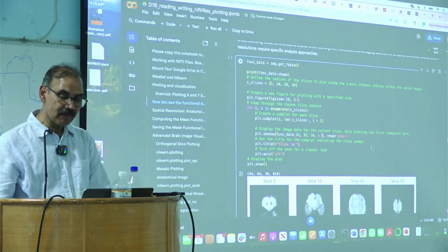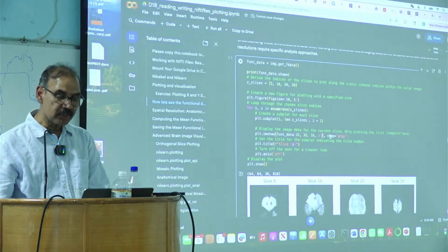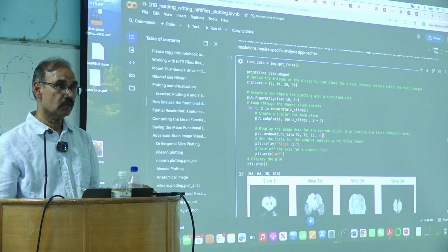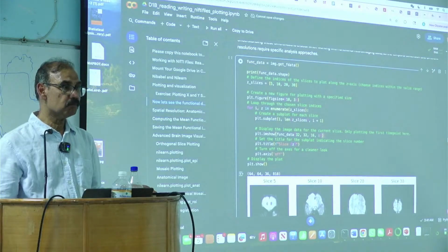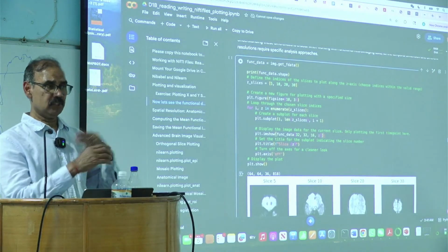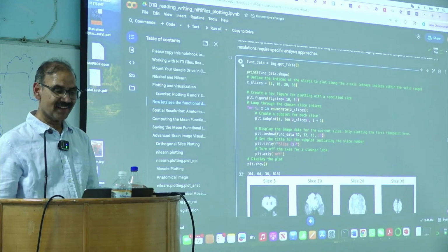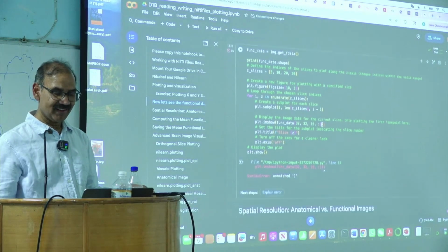Okay, will this work? Does it look okay? Just any random coordinate.